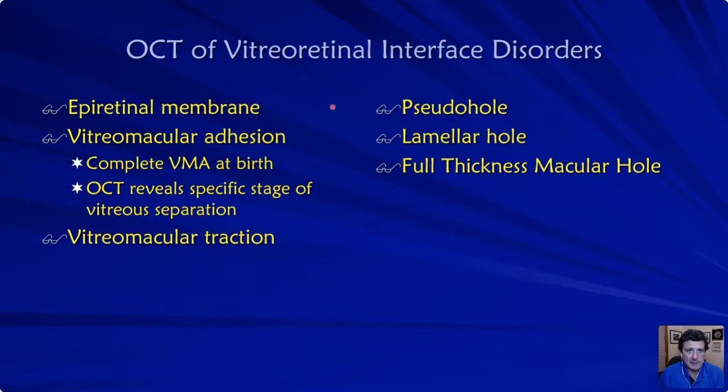But let's just talk about where I see the OCT really helping me out in the practice. And it's really in vitreoretinal interface disorders. And there's been a little bit of naming change coming up here, and I'm going to show you where that came from.